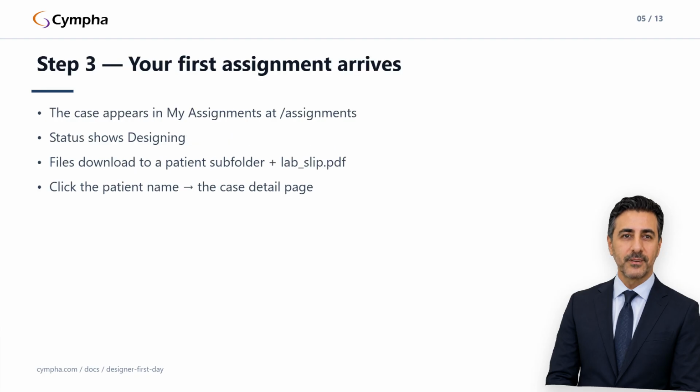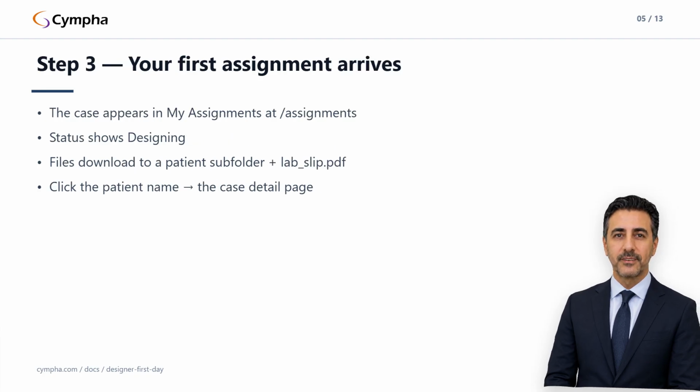That PDF is worth trusting. It's refreshed whenever the case data changes, so the copy on your disk is never stale. Click the patient name to open the case detail page. And before you open any design software, let's read the brief properly.